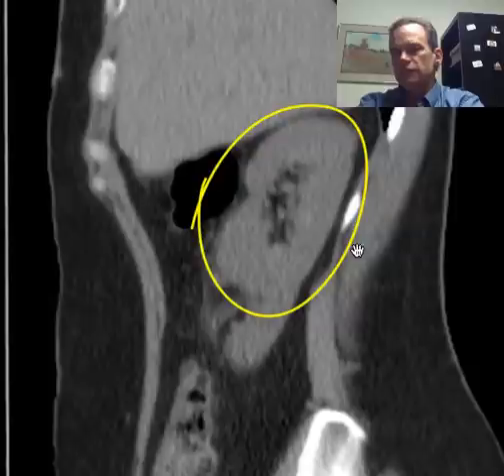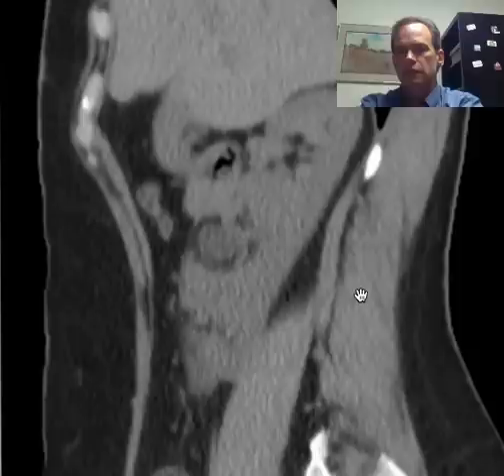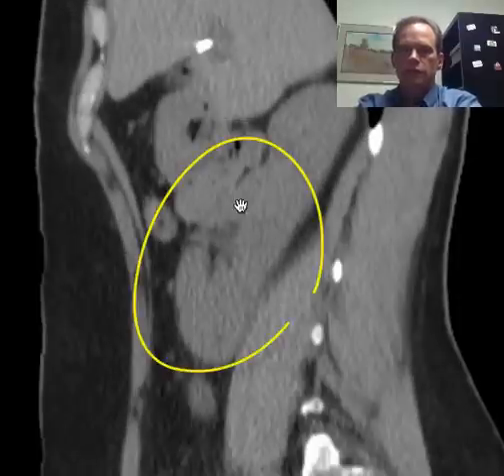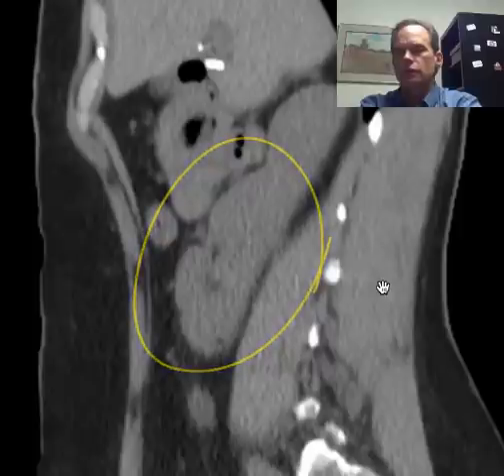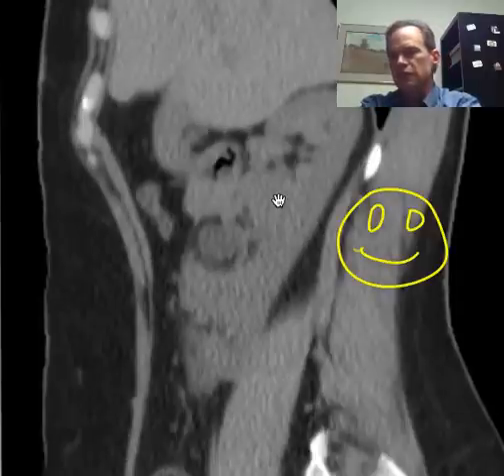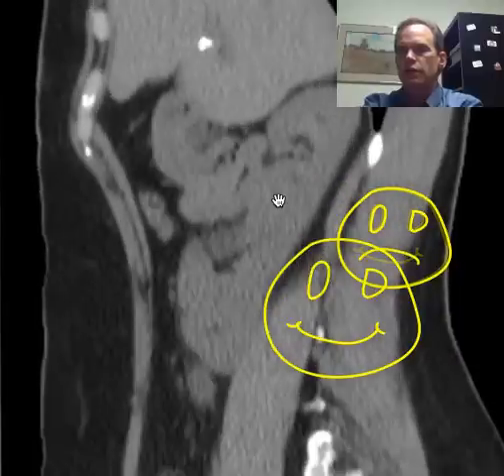You can kind of see that, okay, here we've got one nice little kidney, and we go over this way, and you can kind of tell that there's another kidney right here. So you have two kidneys stuck end to end, really not separately joining, but having developed in such a manner that they share a large area of cortex between them.